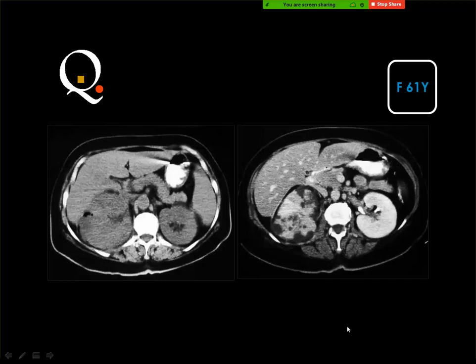Angiomyolipoma of the right kidney. This is air, not fat, and this is fluid. Air? Yeah. Abscess. How can you know that this is air, not fat? You compare the density with a nearby air or the density with a nearby fat. Sometimes it's difficult, but if we have the lung window, for example, then you can easily discriminate.